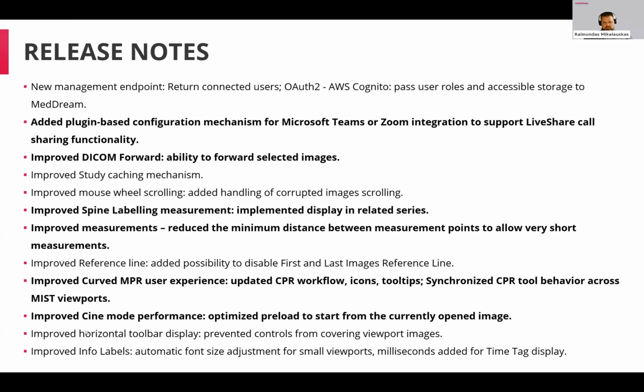When we are showing ultrasounds, the horizontal tab was improved, as it took some place of a viewport, and sometimes the end of the image was hidden. So now it prevents hiding something from a viewport. It is always there where the place is reserved.